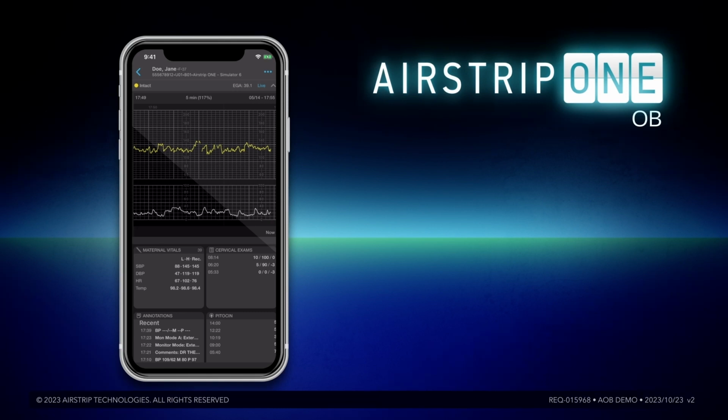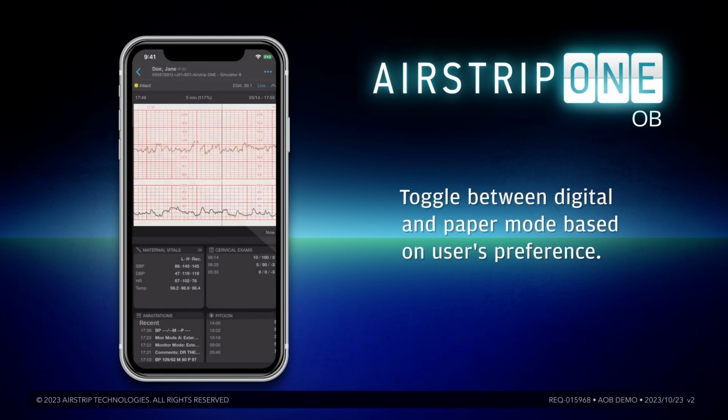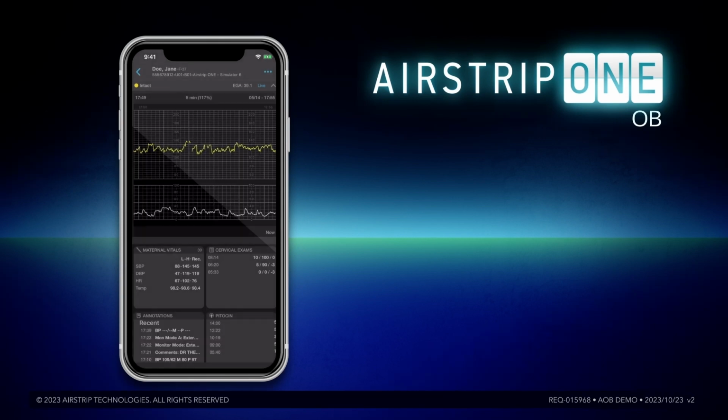There are 2 color modes for the strip view. Selecting the 3 dots in the upper right portion of the screen will bring up the option to change the mode. To change the color of the strip, select Toggle Strip Colors. This will change the strip to a traditional paper strip color. To get back to the black view, just select the Toggle Strip Colors option again.